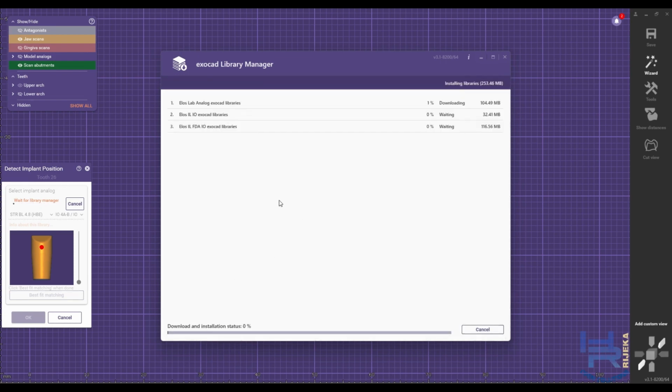Now, importantly, something to pay attention to when using this install process, the libraries will download first, and once they're finished downloading, they'll want to install into the software. And when they're installing, you'll be presented with options, and the options will change depending on what you do or do not already have installed.